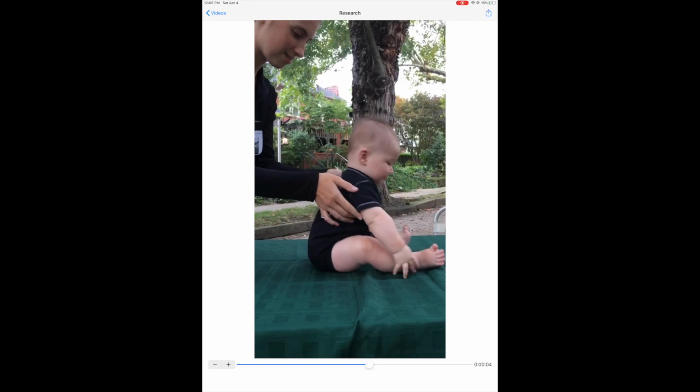And now to actually take your angle, you would just simply click on the areas you want to measure. So let's start by clicking on his shoulder joint. You'll see the blue dot there for our first measurement. Our hip joint. And lastly, his ankle joint. And you'll see right there is the first angle. You can move around each dot if you think you want to get a more precise measurement. If you just want to maybe undo what you just did all together, you could do that too.